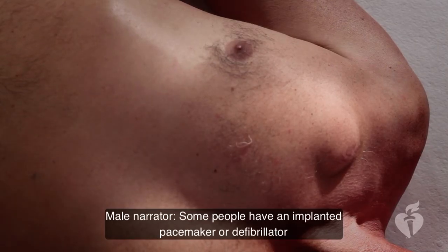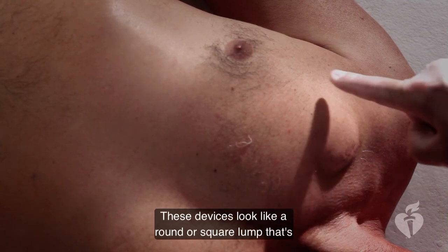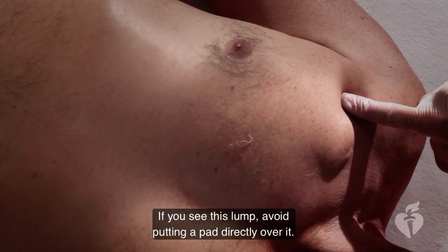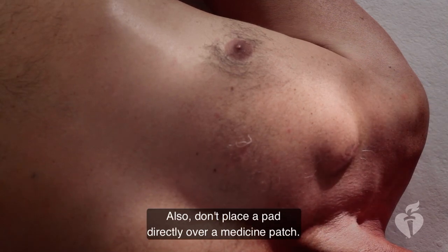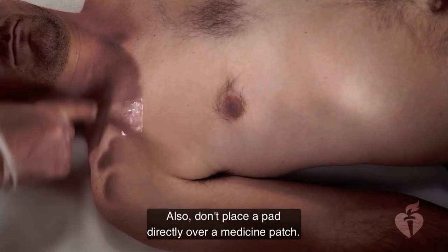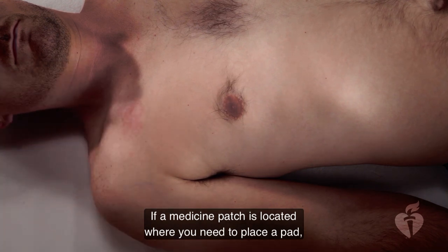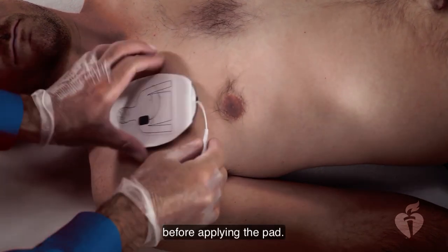Some people have an implanted pacemaker or defibrillator in the same place where you would put the AED pads. These devices look like a round or square lump that's smaller than a deck of cards. If you see this lump, avoid putting a pad directly over it. Also, don't place a pad directly over a medicine patch. If a medicine patch is located where you need to place a pad, take the patch off and quickly wipe the chest before applying the pad.